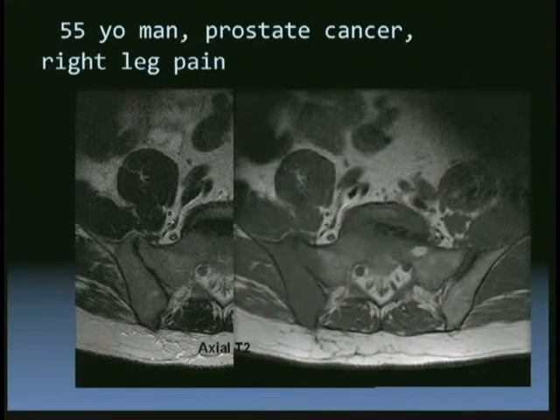The other sequence that was available was a T1 sequence without fat sat. You can see here this is normal marrow, but look here, the fatty marrow is replaced in the sacrum and in the iliac bone.